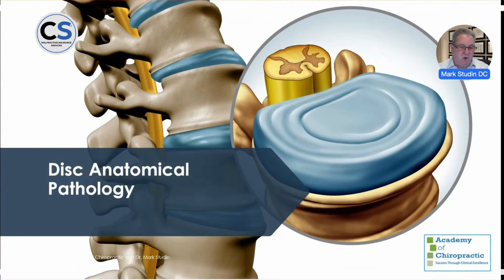This is the spinal cord because it's solid. We know all those things. So now what we're going to do, I've actually got it. Here we go. Here's your spinal cord. It's solid. Sorry, I was moving my mouse in the wrong image. Here's your facets lining up. This is your bone, your disc, your bone. And this is the nucleus pulposus on the inside and the annulus fibrosus on the outside. And these are your lateral horns in the spinal cord, and that's the facet.